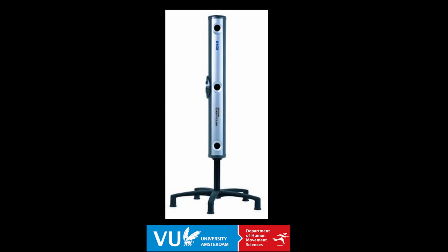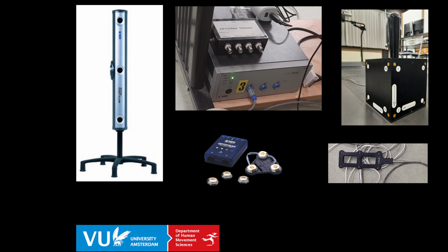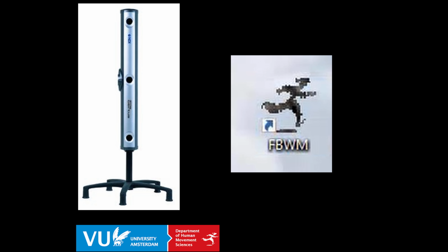Optotrak is a recording device to collect the kinematics data, and it includes cameras, system unit, strobe, markers, calibration cubes, and a pointer. In this video, I will explain how to work with FBWM software to successfully record with Optotrak system.